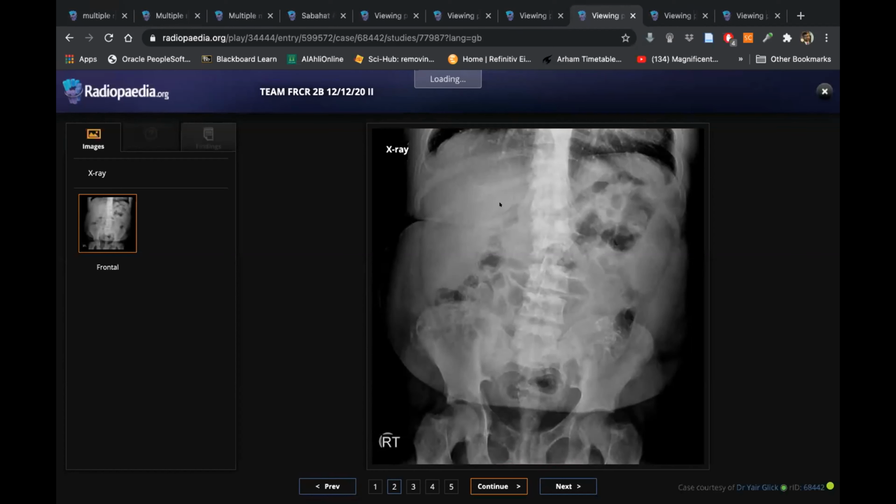The rest of the findings, yes, they were subtle, but if I can convince you, you see this rib, the 11th rib? The density? Then here it becomes a bit loosened, then we again find it, right? So there's a sort of lytic lesion here. Then, look, these are lucent lesions here. Lucent lesions here, right? So these are all brown tumors, which you correctly said.